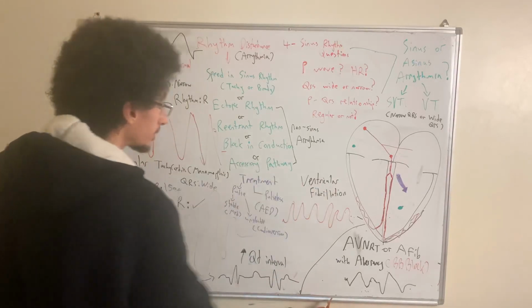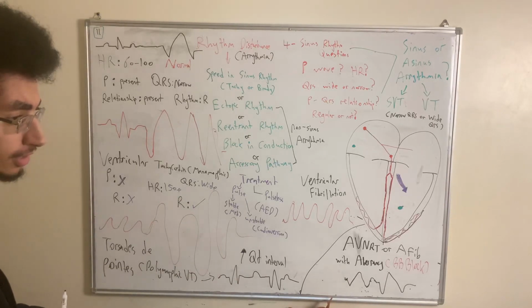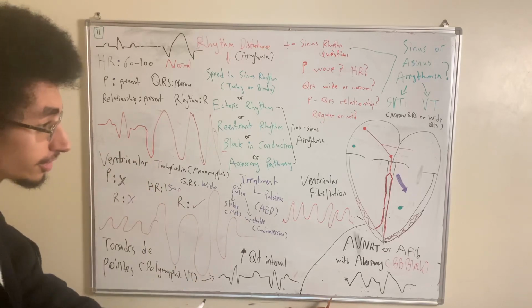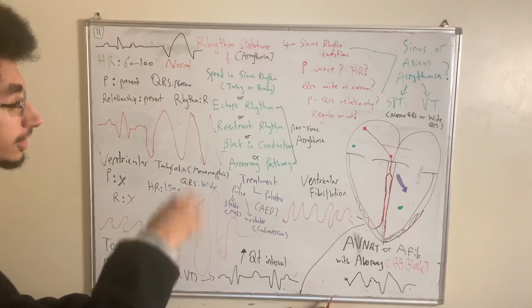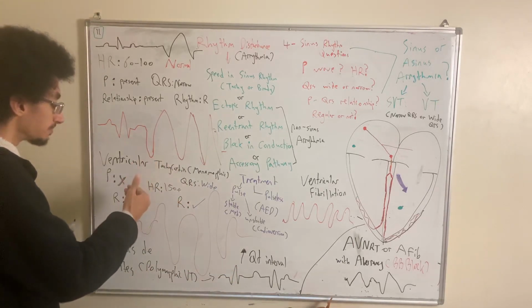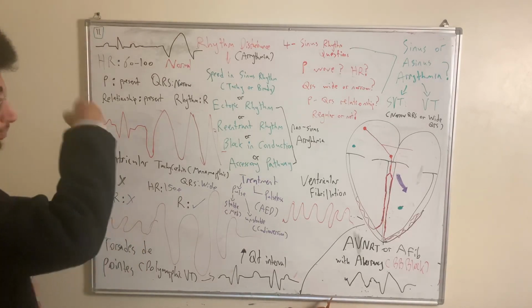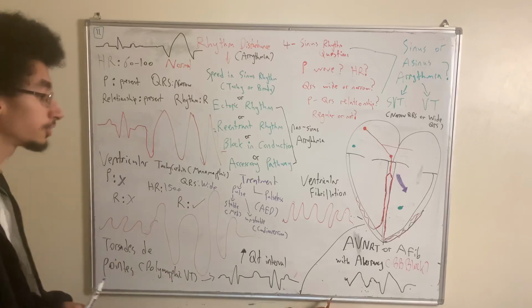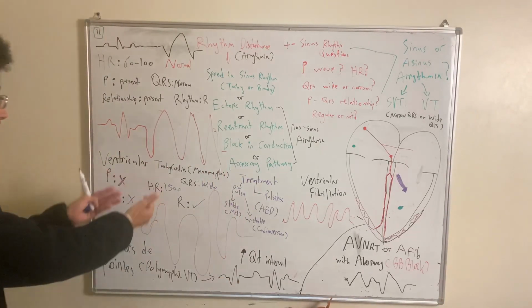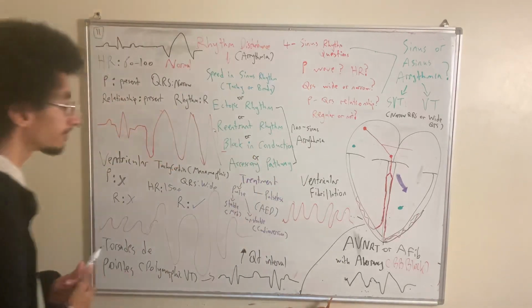And you can think of ventricular fibrillation as like the final form of ventricular tachycardia. So ventricular tachycardia, in terms of severity, from bottom to top, the first stage, monomorphic. The second stage, polymorphic. You can think of it like this. So monomorphic stage 1, polymorphic stage 2, especially with people with prolonged QT interval. And then stage 3 is that eventually these ventricular tachycardias can develop into ventricular fibrillation.